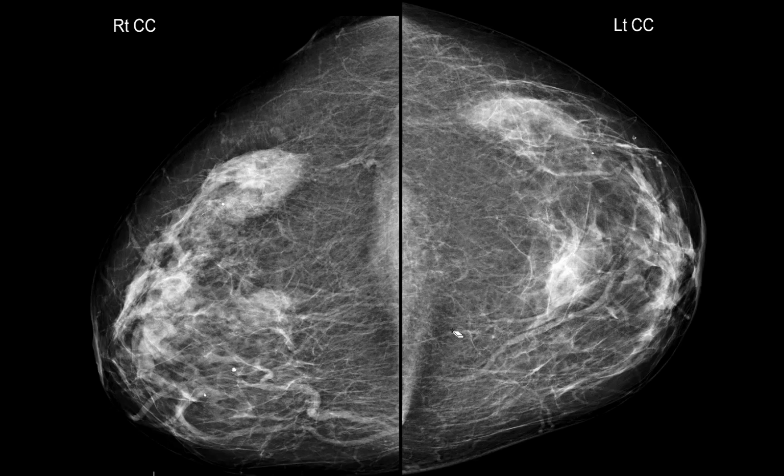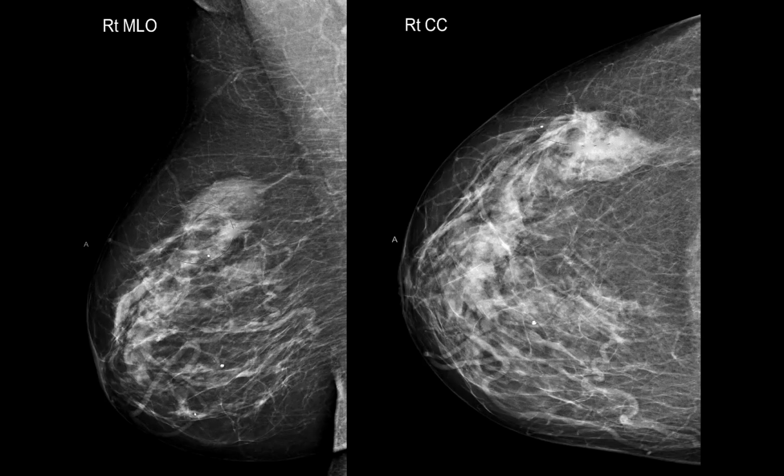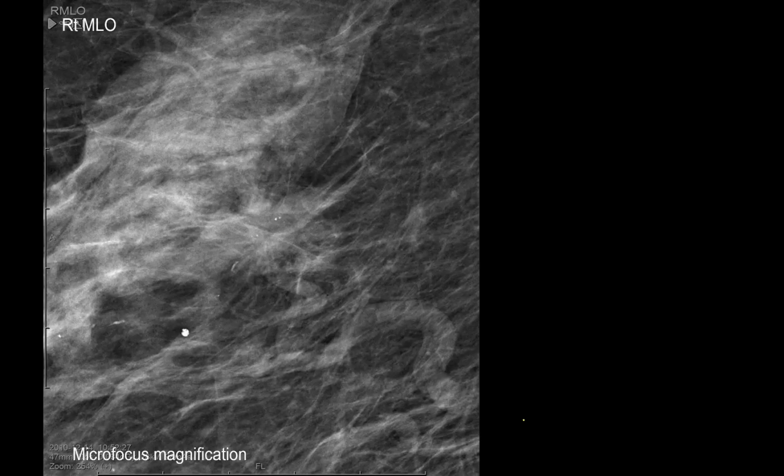But whenever the breast is dense, you also have to look at the contour. Stop here. Do you see any difference? I think there is something there. Right here, look at this. I think there is an iceberg. Is it sticking out? Now this is difficult. This is very difficult. Prove it. Yes, it's here.